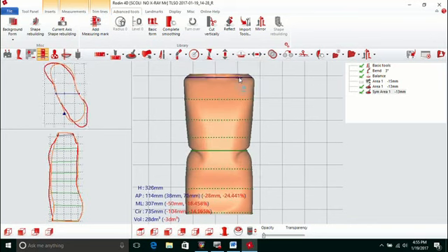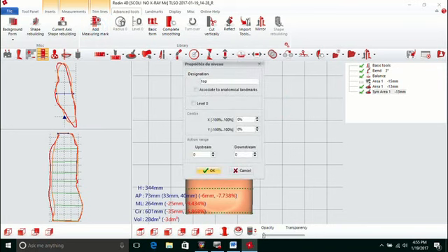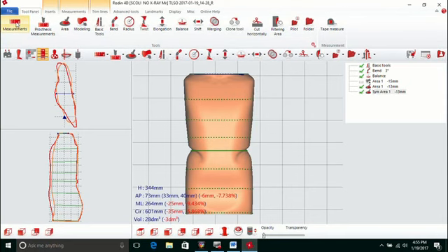And you can put as many measure marks as you want on the model. You can identify more areas if you want, or less, depending. I like to do about this much for starters, and then the model doesn't get too choppy when you apply your measurements. Now, once you have your apply measurements set, you can go to the Tool panel and click on your Measurement tab.